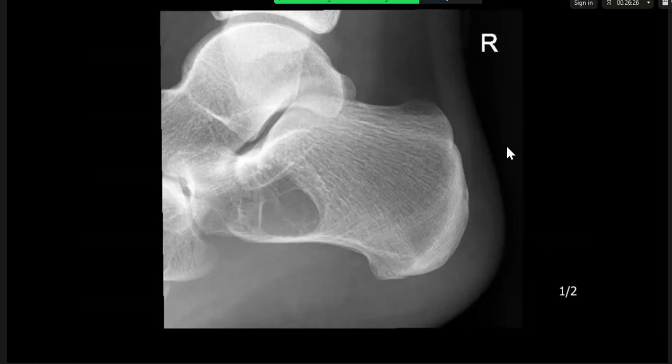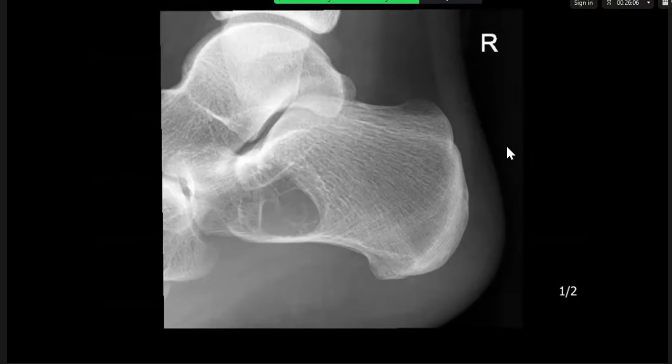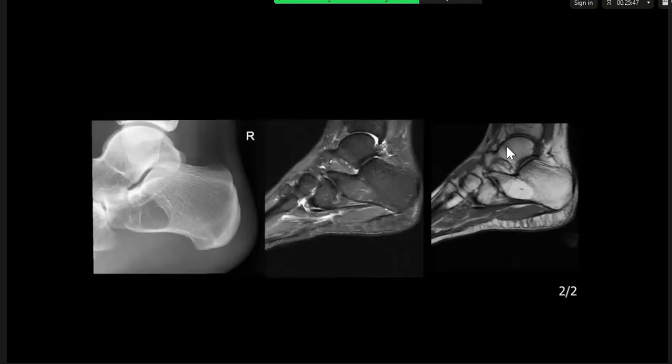I'd be interpreting the radiograph in the light of why it was taken. If this is an incidental finding, I don't think it requires any further action. But in any case, I'd be comparing to any previous imaging to see if there's serial change in the lesion. So there is no previous X-ray. Okay. I think that radiographically this lesion is benign, and I don't see any evidence of a fracture or any other complication associated with it. If there was any clinical concern about the nature of the lesion, a focused MRI scan would be a reasonable course of action. MR?